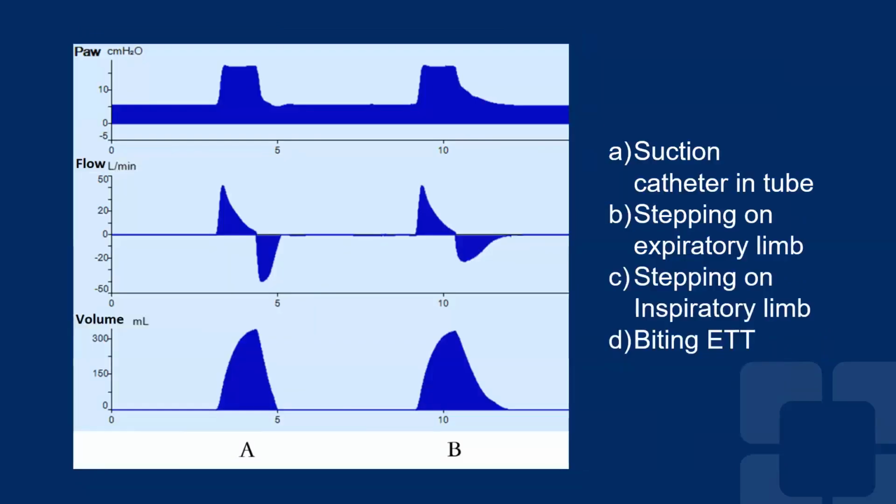And so the pressure cannot drop as it should because there's an obstruction before the ventilator valve that helps regulate the pressure. This is similar to what you would see when the expiratory filter, just before getting to the ventilator, gets wet or gets obstructed or saturated. So the answer is B.